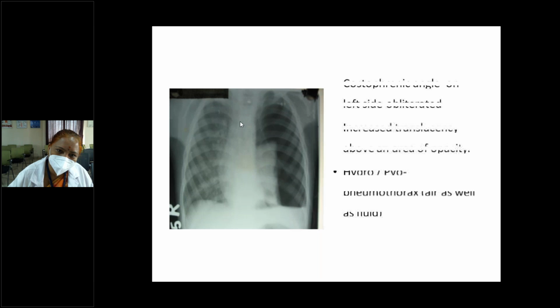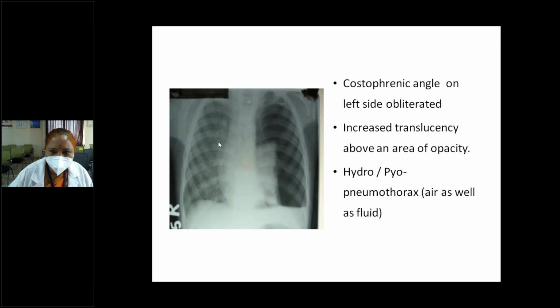Okay, ma'am, mention this. The X-ray is not centered, right, ma'am? There is kinking of the clavicle on the left side. Okay. But what about the trachea? Is it in normal position? Here you are able to see the trachea. Ma'am, is it deviated slightly to the right?